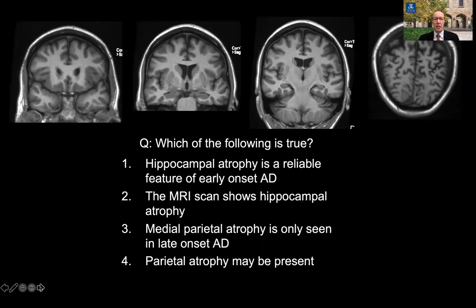However, she had some imaging investigations ordered at the same time. So this was an MRI scan, and here we see selected coronal T1 3D MP RAGE images. These are high-resolution images for anatomy, and this particular T1 sequence provides excellent grey-white discrimination.